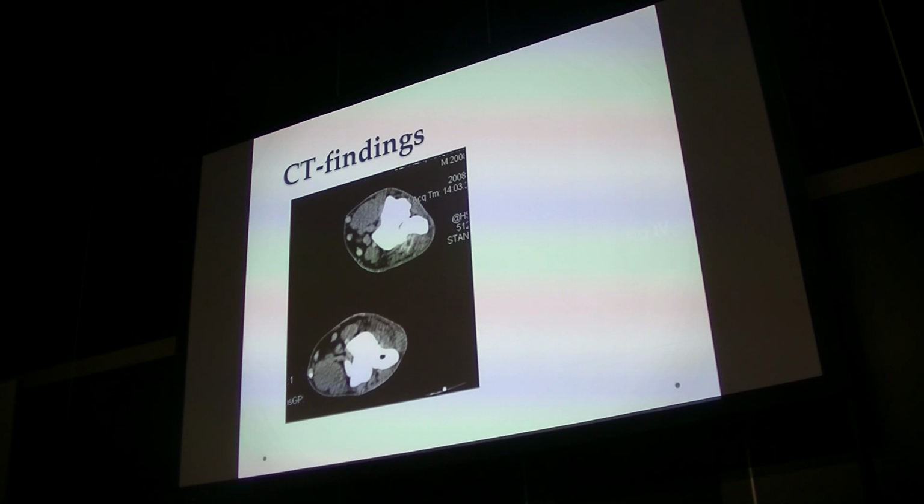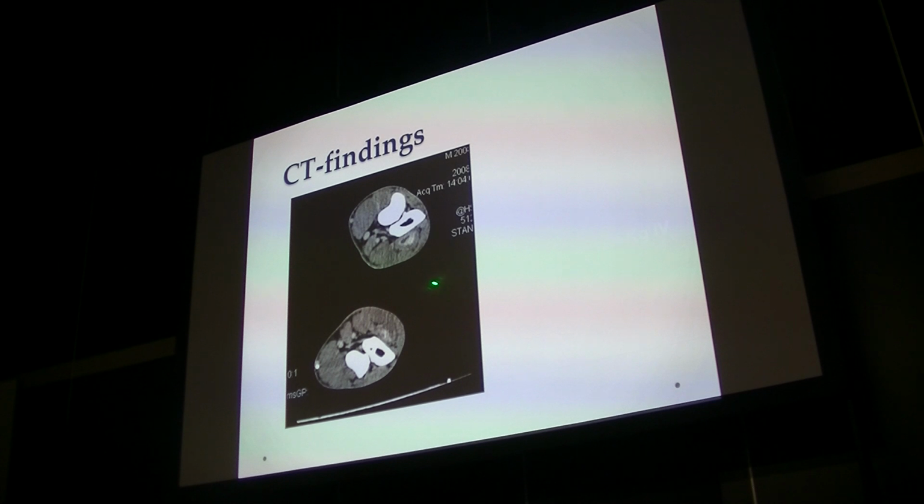So if we administer contrast, we will see contrast enhancement at the medial side of the joint, the area where the tendons are. Also, the tendons often are really distended, and if we look at those images on different levels, we know for sure that fluid pockets are present as well. The hypodensity we pick up on CT is fluid. The contrast enhancement we see, and in this normal elbow, there's just a small amount of contrast that we see, which is normal, a normal uptake of contrast.